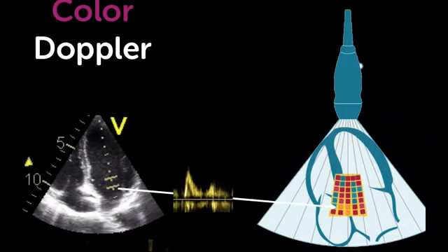There are fairly large variations in which of these components is most prominent. In some patients, mitral valve prolapse can only be very subtle, and the other things, such as myxomatous valve thickening or rocking motion, much more prominent. The 2D information of the mitral valve is certainly important, but it does not necessarily allow you to make the diagnosis of mitral regurgitation. What is also important is the extent of valve pathology does not necessarily correlate with the severity of mitral regurgitation. So, to detect mitral regurgitation and to determine how severe it actually is, you have to use color Doppler.